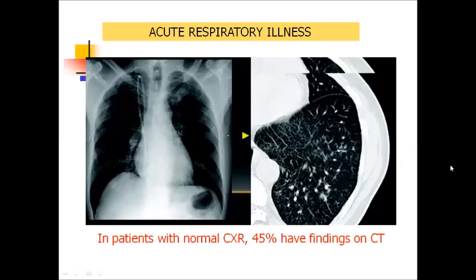In acute respiratory illnesses, it's very important to make a proper diagnosis and remember that not all changes of lung tissue pathology will be present on plain X-ray films.